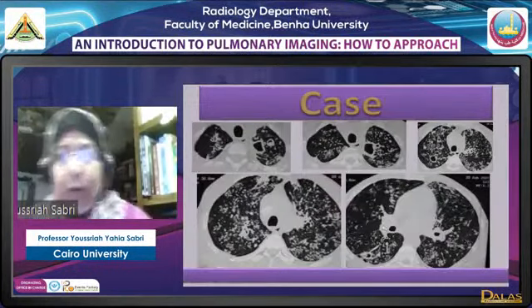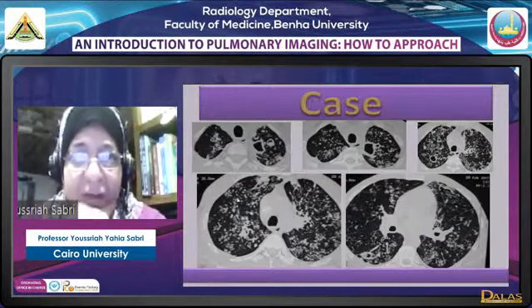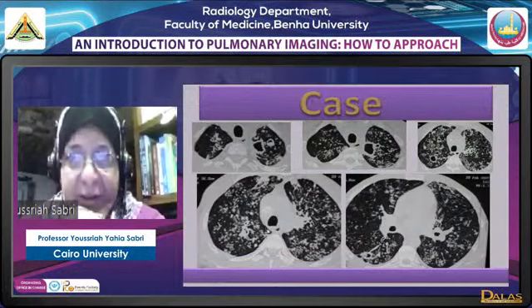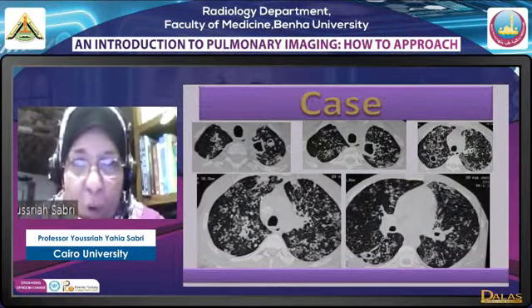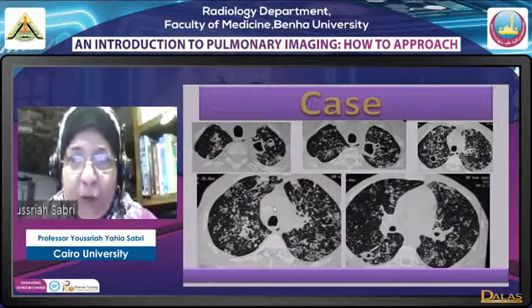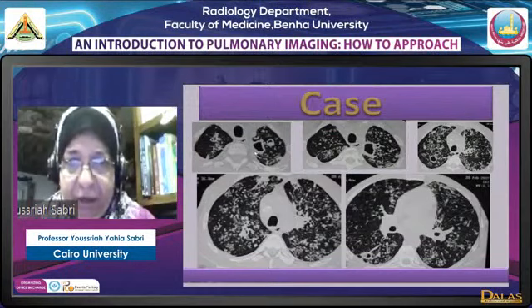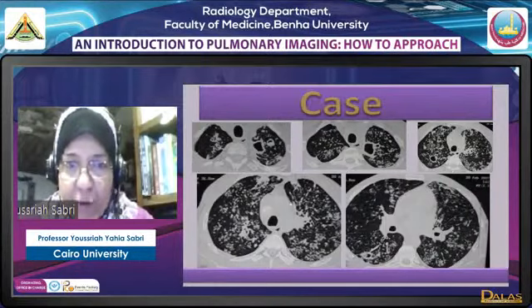Now, what do we have here? We have again multiple nodules, but they are different in appearance than the miliary. They are bigger, they are denser, and they are more irregular. These nodular appearances are what we call acinar opacities. Here they are associated with a cavitary lesion in the apex, with cavitation with mycetoma, cavities and cavities with mycetoma.